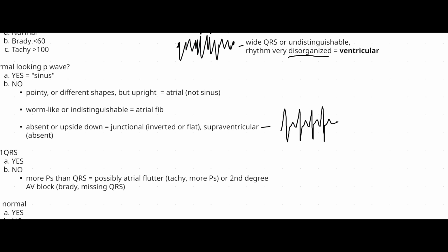And this would be more spaced out normally. But it's going to be a rapid rate, normal narrow QRSs with no P, just the T. You're not going to see a P with no T, but you can see a T with no P because the P is smaller, T is bigger. So the P is hidden behind the rapid QRST.